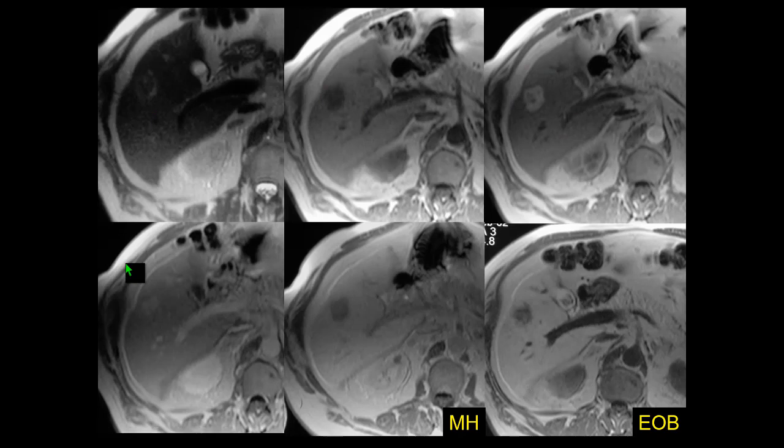So washout is important to make a correct diagnosis of malignancy of focal liver lesions: wash-in, washout, HCC, metastasis, but it is specific only in 2/3 of the cases. That means 1/3 of hypervascular malignant lesions do not show washout. And in the hepatobiliary phase, either with Multihance or with EOB, the lesion is hypointense because this is not hepatocytes.